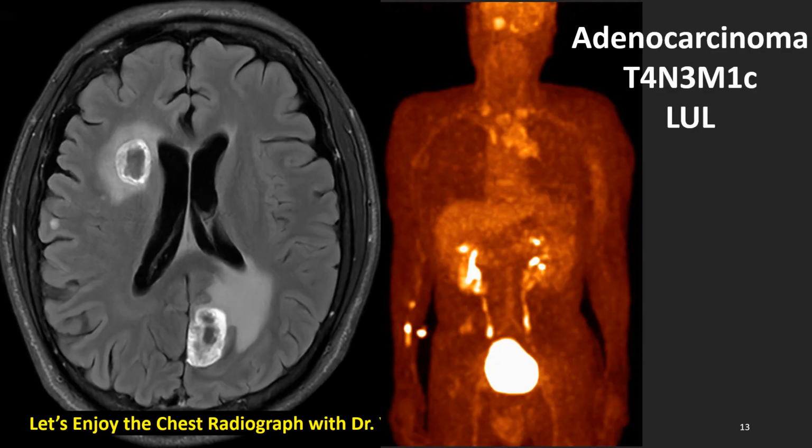His brain MRI shows multiple enhancing metastatic nodules. This is edema around the tumor. Yes, multifocal brain metastasis. And PET-CT shows a left hilar mass with conglomerated multiple mediastinal lymph nodes, contralateral lymph node enlargement, right supraclavicular and left supraclavicular lymph node enlargement, N3 staging, and multifocal brain metastasis. So adenocarcinoma of the left upper lobe, T4, N3, M1c, far advanced staging.